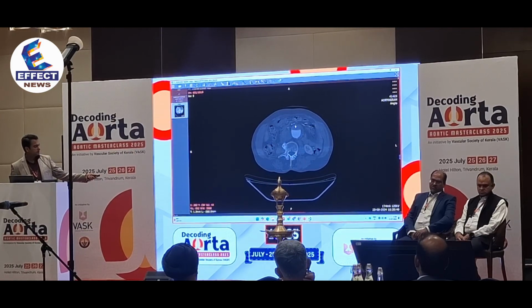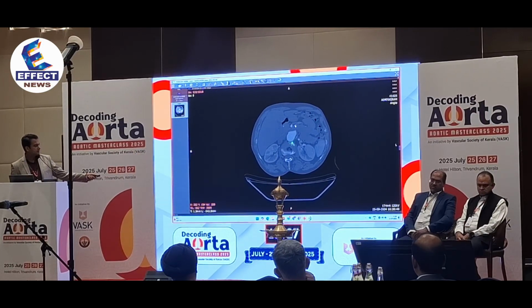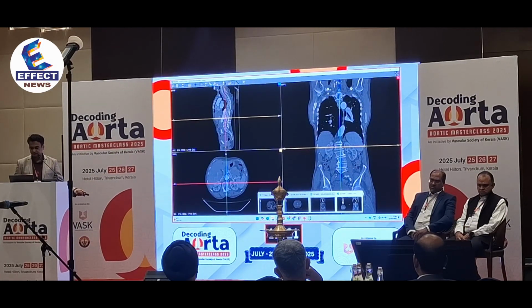There is a couple of lumbars, so that's one of them, right in the middle of the sac. And then there is a pair that is there in the proximal end. So again, if you would like to see this in the recon view as well.